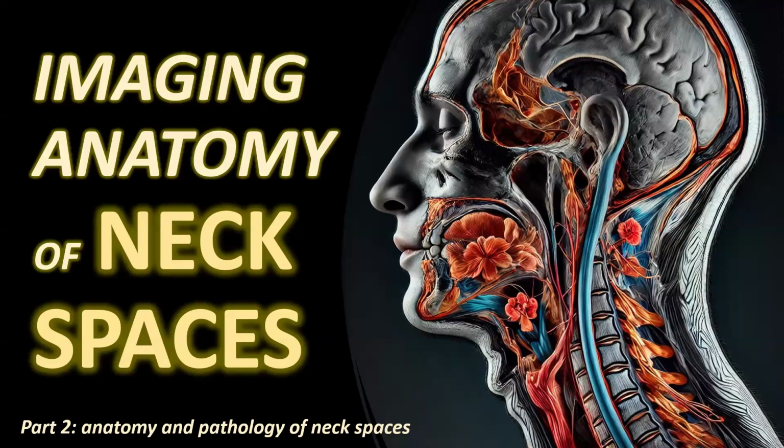I'm a neuroradiologist working at Ghent University Hospital in Belgium, and welcome to part 2 of my video on imaging anatomy of neck spaces. In this video, I'm going to continue discussing the anatomy of neck spaces. I'm going to discuss each and every one of the neck spaces discussed in the previous video in a bit more detail, and I'm also going to illustrate the anatomy with a lot of pathological examples.